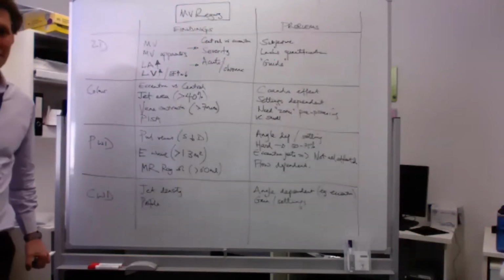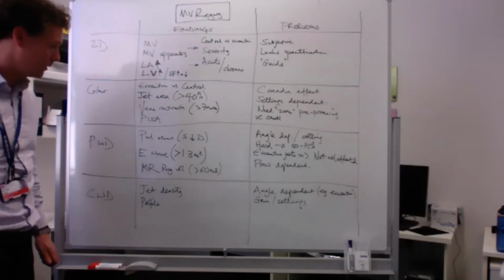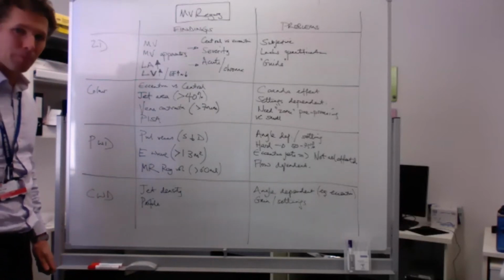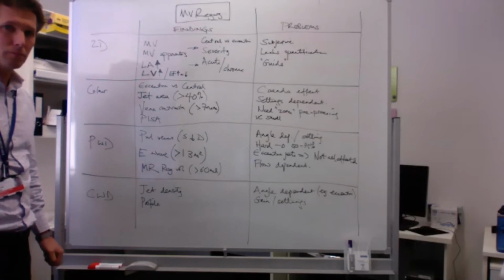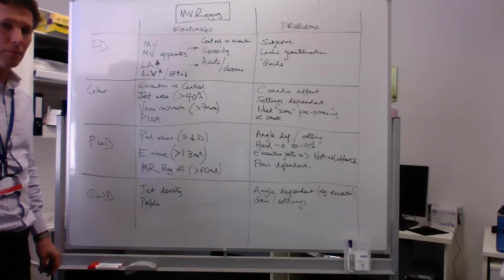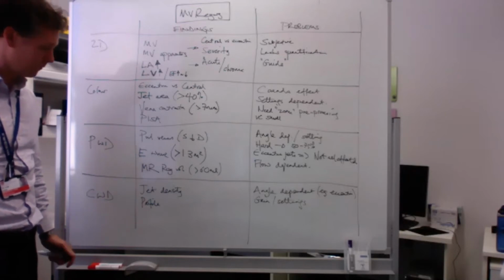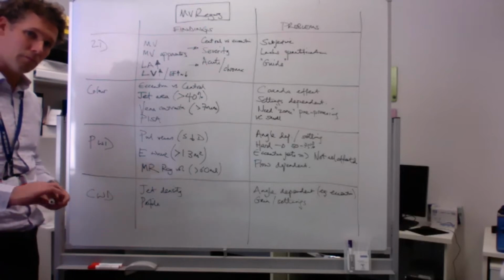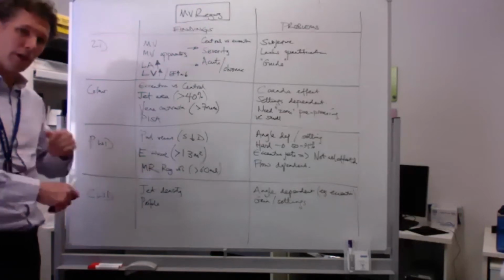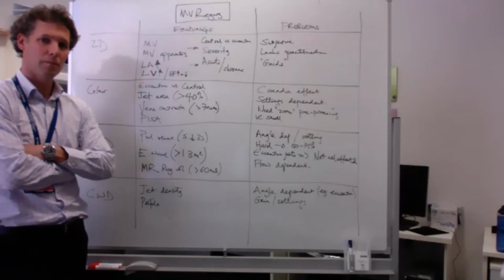If it's a repair, I assess it exactly the same way. So things like vena contracta, the size of the color jet, any blunting of the S waves. Hopefully it's nothing severe, so you'll only be looking for blunting rather than reversal of the pulmonary veins. If it's a replacement, you're looking at paravalvular leaks, then you'd also want to describe how much of the circumference is occupied by the regurgitation on color. So that's a qualitative, or semi-quantitative, assessment.